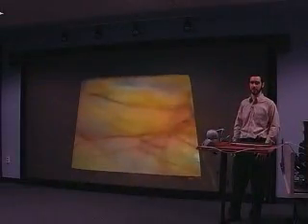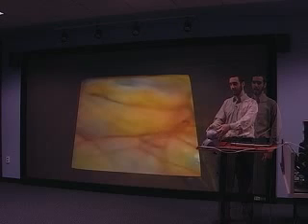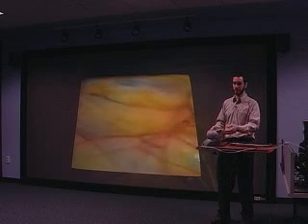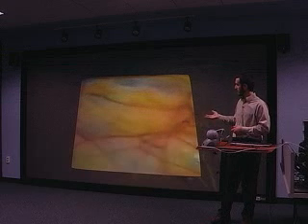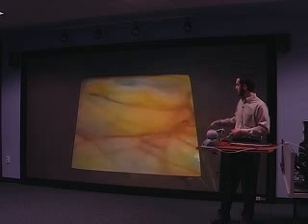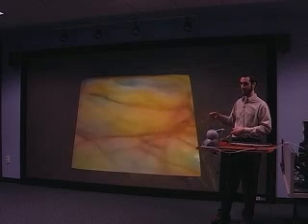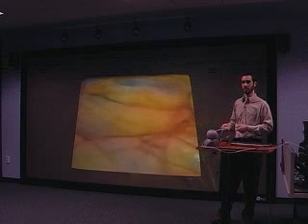So I'm Kyle Maxwell. I'm working on developing a deformable surgery simulation with virtual haptics. In the device here there's motors that will resist your motion, so that you can understand or feel what's going on in the simulation. If you touch against the surface, it's going to put the brakes on and it's going to feel like you're actually touching it, which is what the surgeon would feel as well.